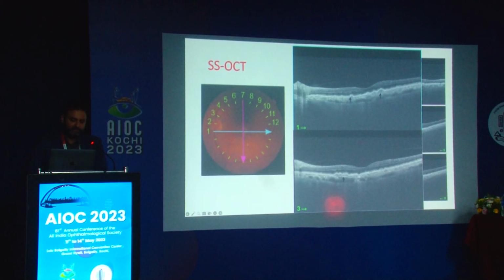However, you can see these, right? So the multiple pigment epithelial detachments, they aren't high, but they're kind of spread all over. It's almost like spilling a glass of water on the floor. It'll actually flow and be much more in horizontal extent than vertical extent.